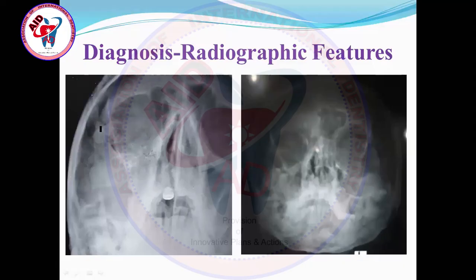There is displacement of the frontal process of the zygomatic bone, and there is separation at the frontal zygomatic suture. Look here, and also at the infraorbital region and coming down towards the zygomaticomaxillary buttress region. Here is also a separation sign and step deformity.